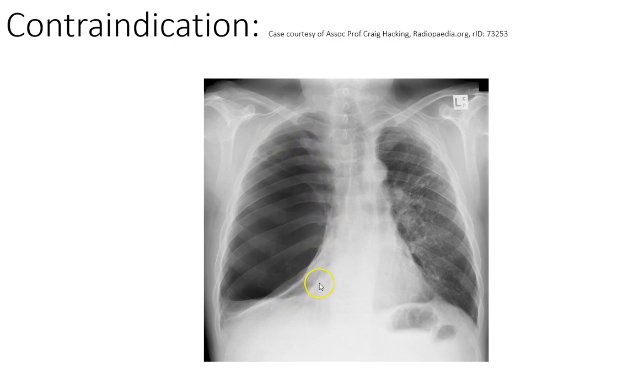So the lung around and between the bullae could be quite normal, but it gets squashed as the bulla just fills more and more of the space. So we have some massive bullae on this side of the lung, completely making it so that that right lung around that has completely gotten squashed and is not being of any benefit at all.